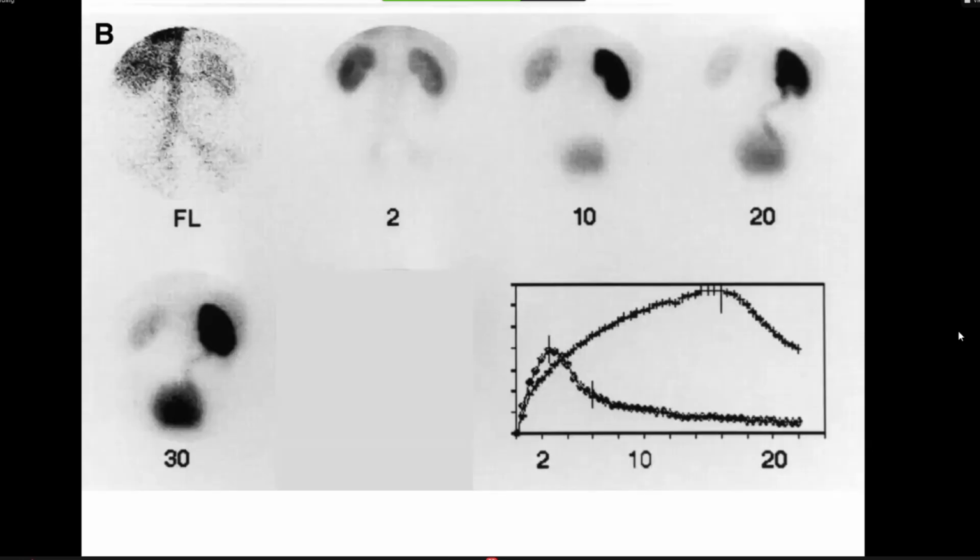And if I show you this curve now. Sir, now there is a partial obstruction of the right side. Yep. After Lasix, there's a fall, but not a complete fall. And on the left side, it's normal.